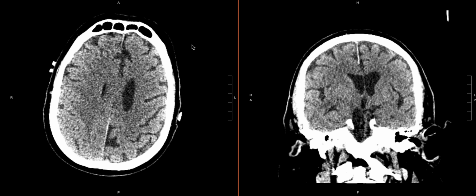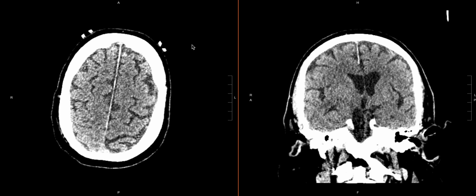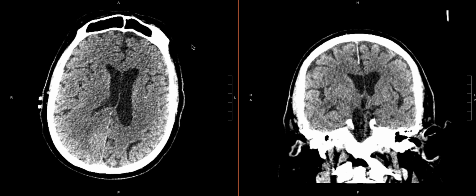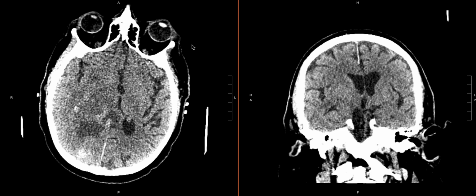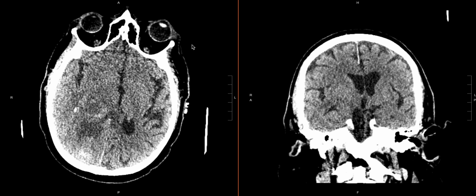This is the first in our case series of acute subdural hematomas seen on non-contrast CT scans. And this is a tricky one, which is actually not uncommon for subdural hematomas, part of the reason we discuss them for the purposes of this call prep curriculum. So to start with this case, we're going to stick to the basics here.